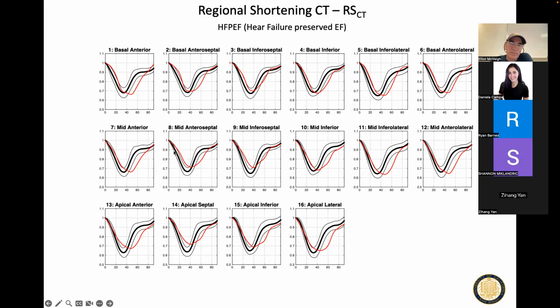So in this patient who has early heart failure with preserved ejection fraction, their heart is still producing sort of a 50% ejection fraction. But when you look at their strain curve, you think, you know what? It's significantly different than the strain curve of what would be a normal heart. And here it looks more like it's just half a sine wave, right? It looks like instead of this rapid reduction in myocardial length, it's slowed down. It's a little bit above average, but it's getting in there.